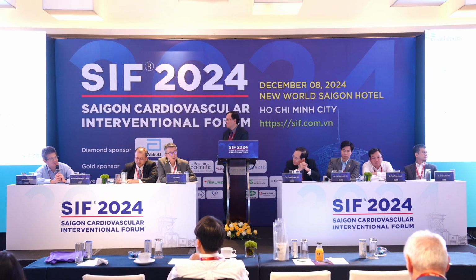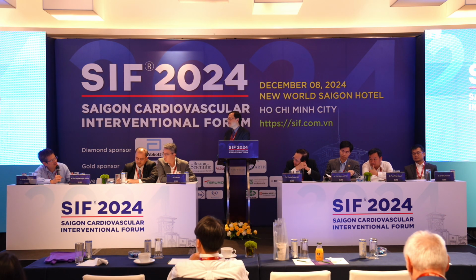The rotor burr stuck, you used your second wire to loosen the rotor burr and then you used Dynaglide. Is that right? Yeah. What if that doesn't work? What is your next step?